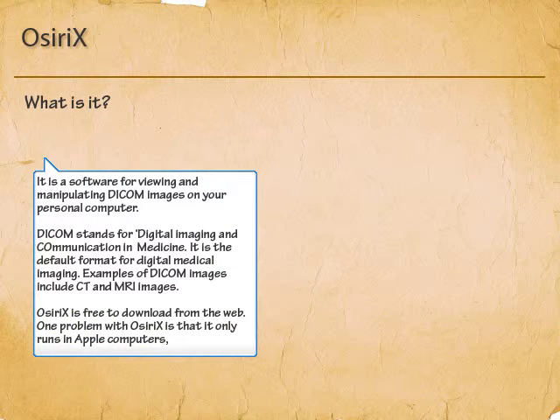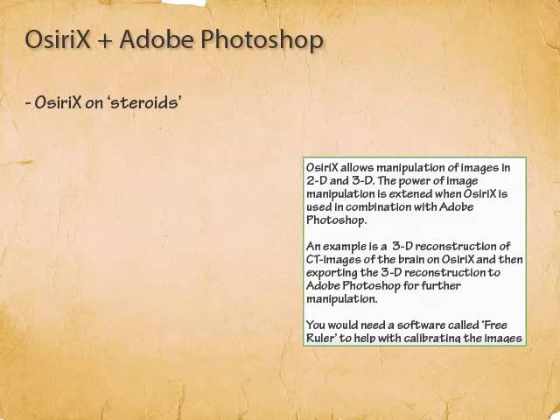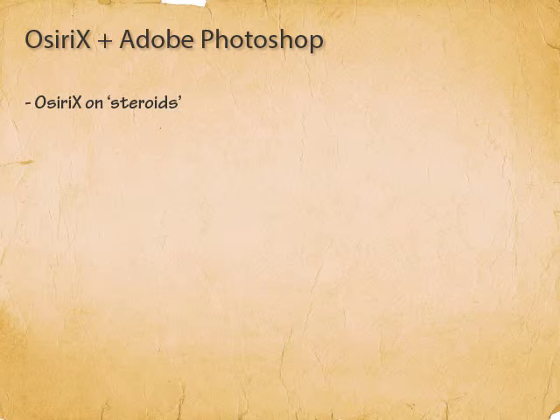OsiriX is a software for viewing as well as manipulating DICOM images on your personal computers, particularly Apple computers. It doesn't work on Windows. The fact that it allows you to work on your own personal computer is the strength of OsiriX. OsiriX allows you to manipulate CT scan images and MRI scan images in 2D as well as in 3D.